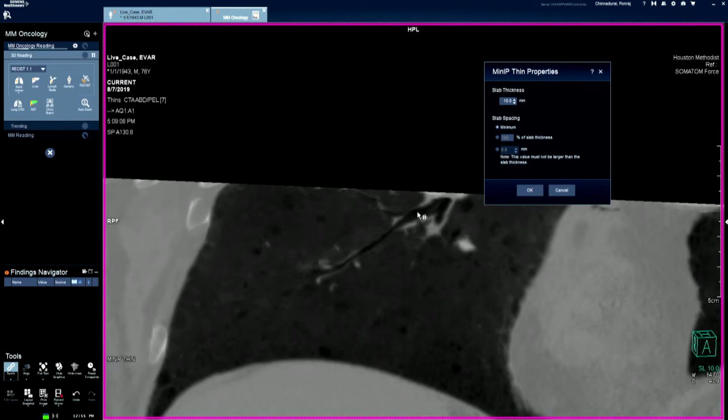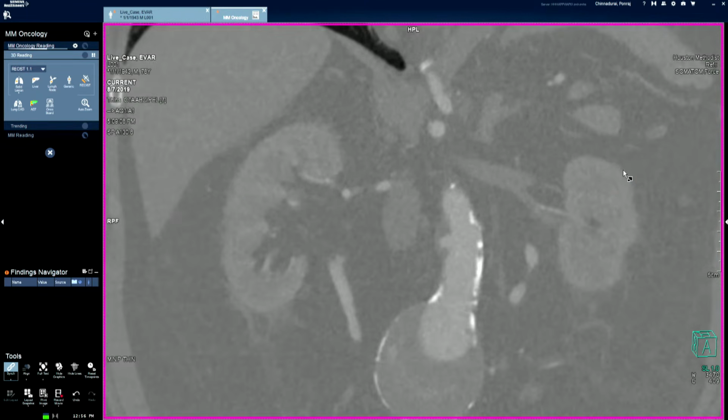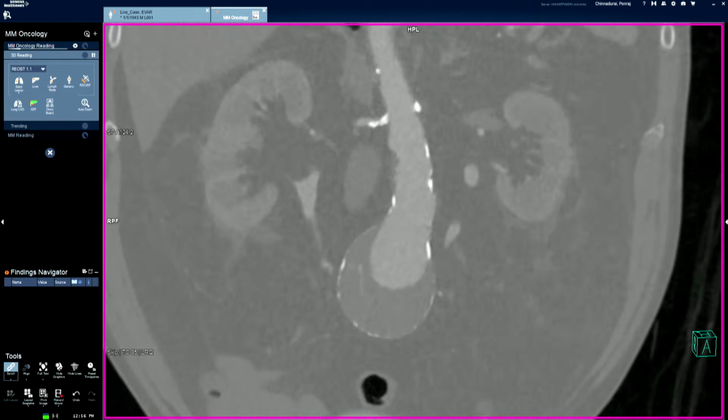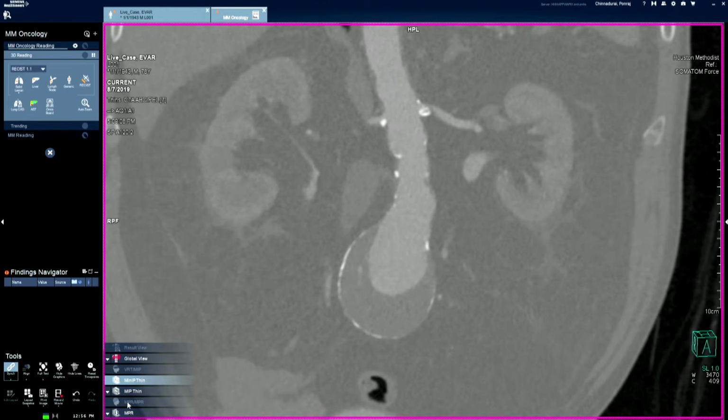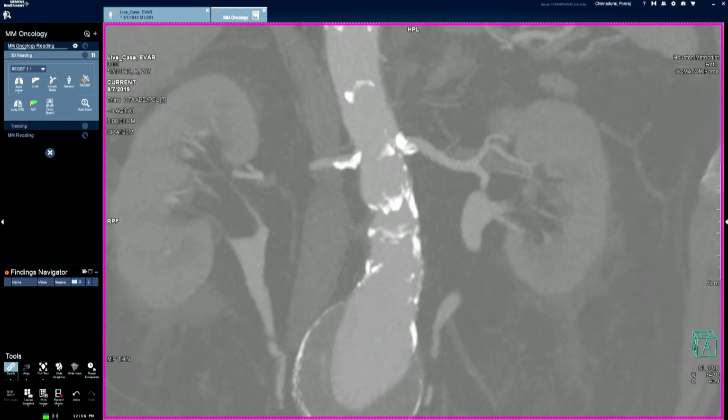So what it is trying to do is, whatever thickness I give you, 10 millimeter, wherever my current slice position is, it goes back 5 millimeter, goes forward 5 millimeter, and shows you only the lowest pixel in this slice. And that is what you are seeing as airway. And if I did the same concept in the aneurysm neck, for example, at the level of renal, I'm doing a MIP thin, and I'm making the slice thickness 10 or 15 in this particular case.